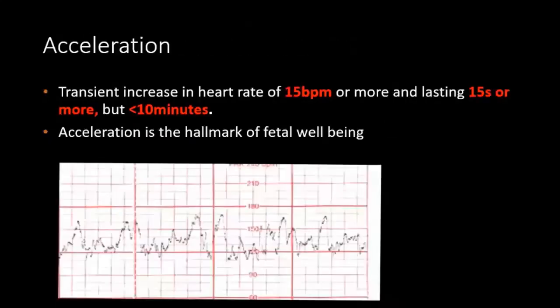Acceleration is a transient increase in the fetal heart rate of 15 beats per minute or more, lasting 15 seconds or more, but the acceleration should be less than 10 minutes. If it is more than 10 minutes, it means there is a shift of baseline already. Acceleration is a hallmark of fetal well-being, meaning that the baby is still good inside. Again, that is the baseline, and that is the projection of the fetal heart acceleration from the baseline.